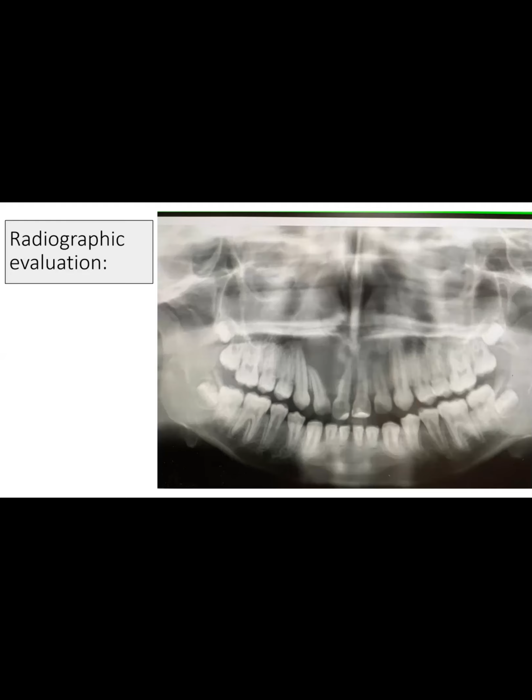So the teeth are vital. Do you want to start suspecting what? Location, right? It seems like it is at the apex, also extending between the teeth. Are the teeth displaced? Yes, they are. And between which teeth? The central and the lateral. So if you were living about 20 years ago, you would have suspected what?